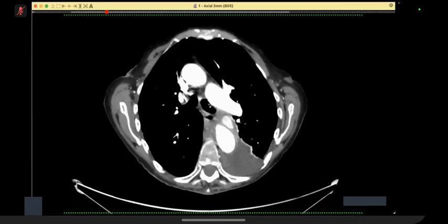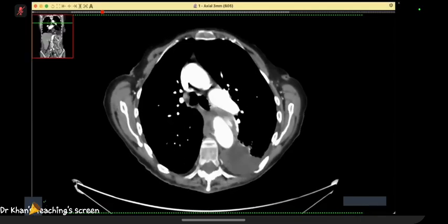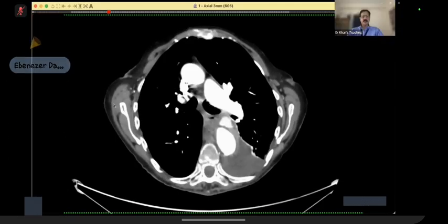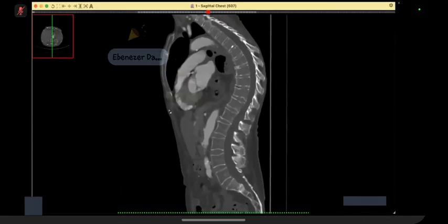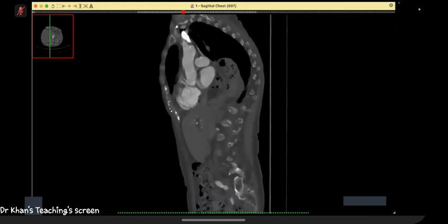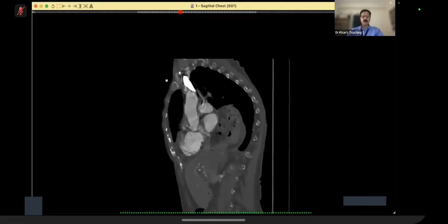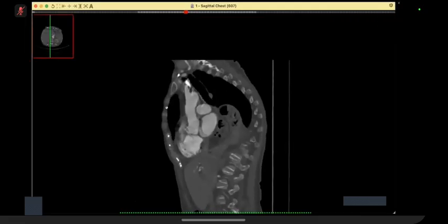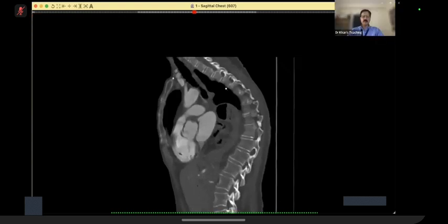Yes, there is some small contrast pouch which I can see here. Let me show you a suggestion. So let's go from anterior to posterior. Let me slightly change the location now. So ascending, let me slightly make it bigger for everybody.